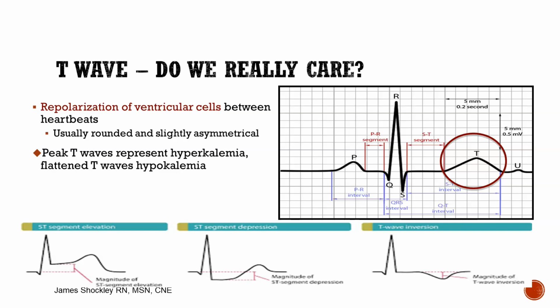You have some sort of history of heart disease. And then you have the T-wave. And then the next one, you have T-wave inversion. So everything comes down, and instead of being an upright wave, that T-wave is inverted, and that simply means ischemia, either acute or more likely chronic, because they have some sort of cardiomyopathy.